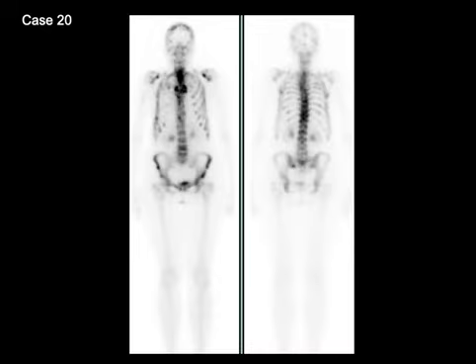Case number 20 shows whole body images in a patient with metastatic breast cancer. There are foci of increased uptake in the ribs, spine, and the pelvis, consistent with osteoblastic bone metastases. And the finding that gives away the diagnosis is right here, seen in the right side of the chest. You see how compared to the left side, several ribs are missing on the right side. This is because this patient has received radiation to their right breast for the treatment of breast cancer, and radiation causes marrow replacement, because of which there is no MDP uptake in this region, and that is a clue that this patient has history of breast cancer.